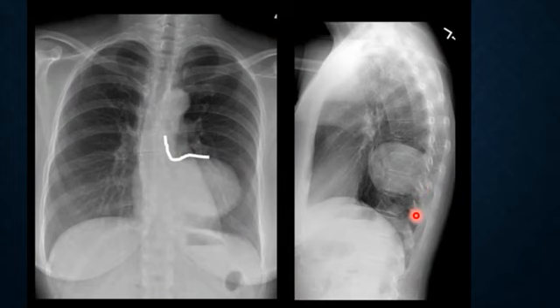Another example, you can see here, this is a mass, a retrocardiac mass. The angle it makes is sharp, narrow. You can see here the angle is acute, not wide like we saw before. It indicates that it is a ball on the rug, not under the rug. It means it is pulmonary in location. It is from the lung, not from the pleura. Clear? Get it?